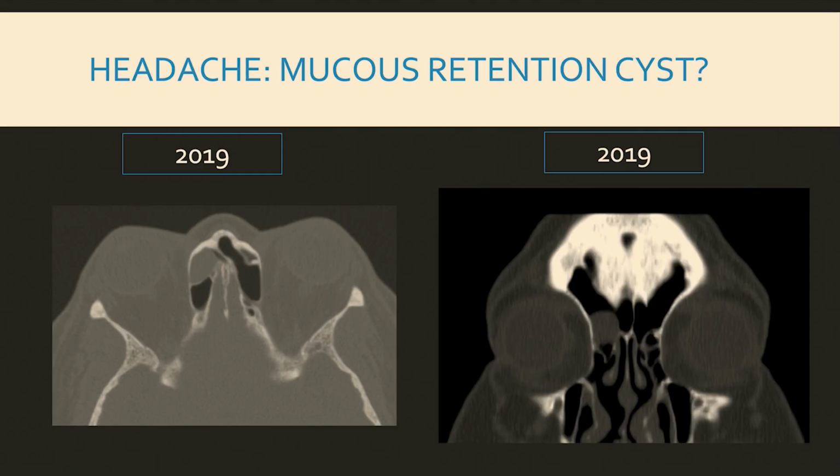Okay, this is it. This is the case I want you to remember from this talk, because I've seen follow-ups on this and they've been missed. Think about your sinonasal cavity, guys. There are certain sinuses that touch brain, and there are certain sinuses that don't. Your frontals touch your brain. Your ethmoids touch your brain. Your sphenoid touches your brain. The maxillaries don't, right? But this is where you get into problems.